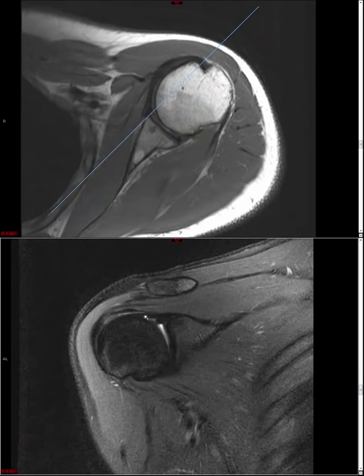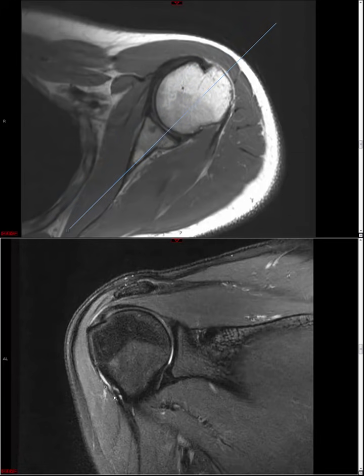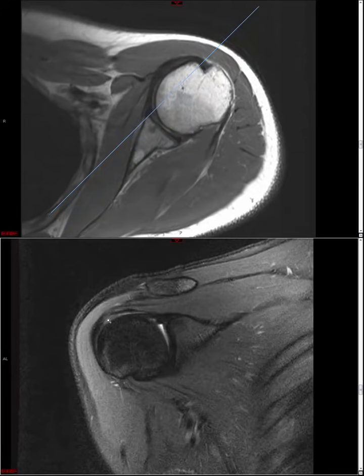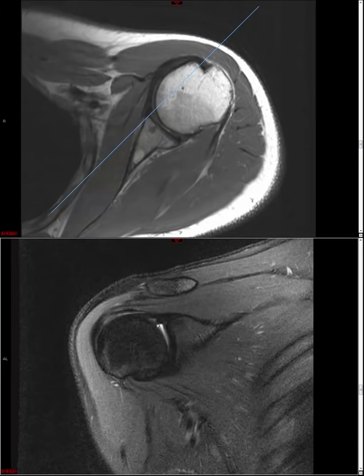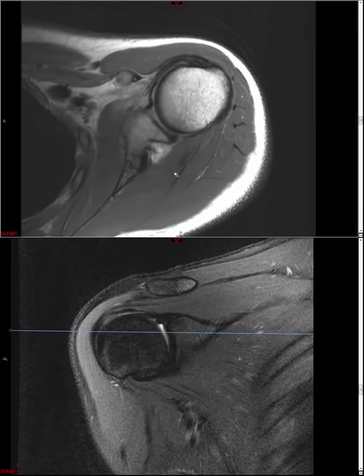So you can see this biceps tendon comes all the way out and then comes straight down. All right, so here's the biceps here. But if there were a partial tear of subscapularis here, then what you might see is the biceps coming down across like this and then doing something like this, cutting the corners before getting to the bicipital groove, and that would be a sign of biceps subluxation. I'm simplifying things a little.